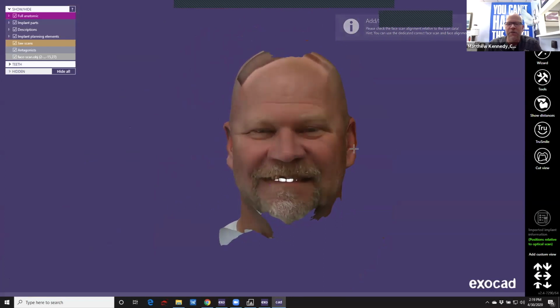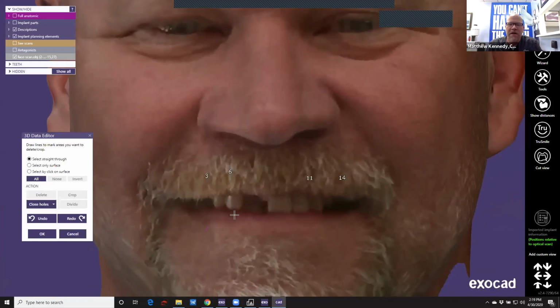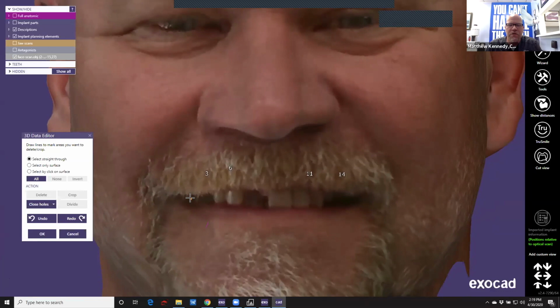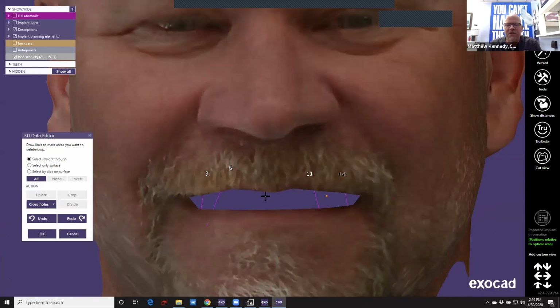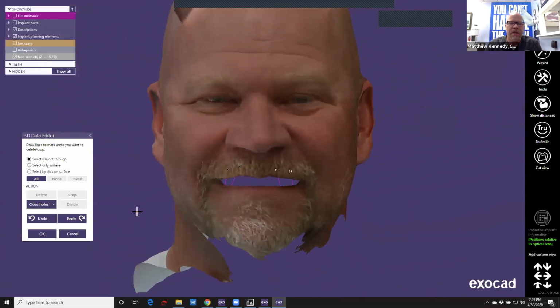All right, so we're also going to go ahead on the image. We're going to edit mesh. We're going to open up the mouth. We learned something new the other day from Dave. He was going to come in here and click. And instead of closing this circle, we're going to get it pretty much where we want, and then come over here and hit delete, and that'll make a much cleaner removal of triangles.